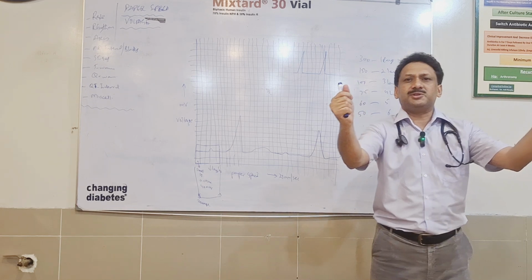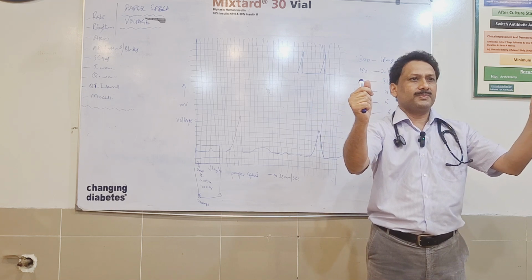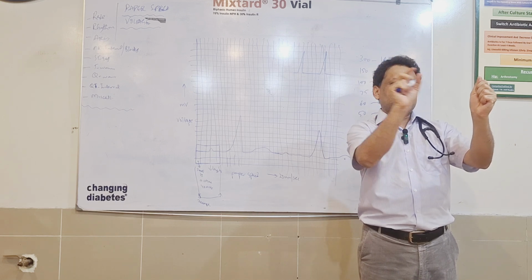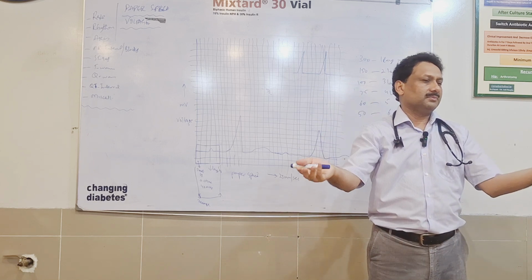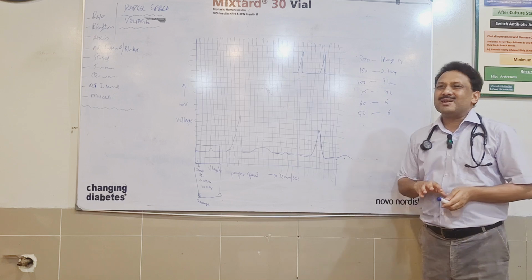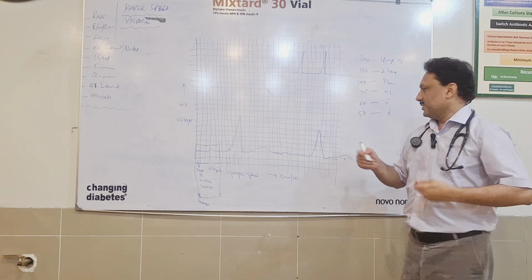You take hold of an ECG. Simple rule. You take hold of the ECG paper. You see on the ECG paper, between two RR complexes, 5 small boxes, rate is 300. 10 small boxes, rate is 150. So just calculate like that. If you want to calculate the rate exactly, then there is another way out.